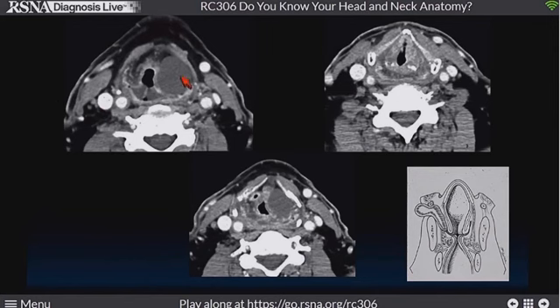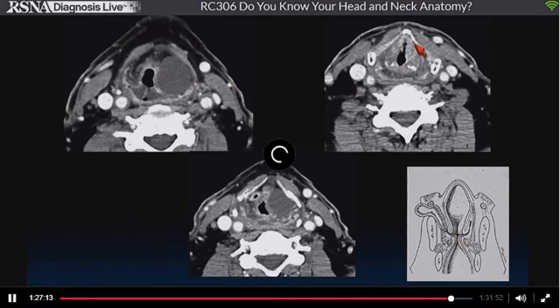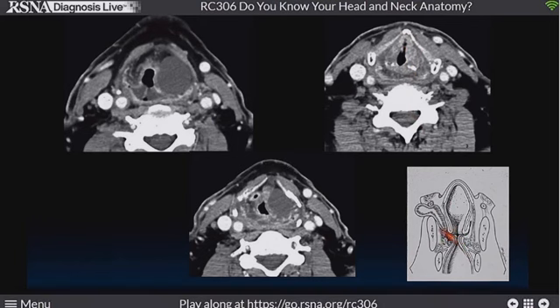Now, this patient had been radiated, so here indeed you have a laryngocele, and when you see a laryngocele or saccular cyst, you've got to look for a tumor down at the ventricle, and here this patient does have one. But even if you don't see it, the clinician has to go in and look for that themselves. So here is the saccular cyst or laryngocele.